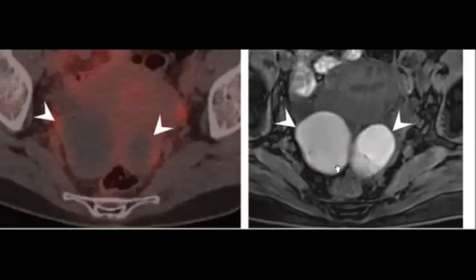And what in the MRI here? I'm checking the answers. What in the MRI? Look at the sequence, try to recognize which sequence. Is the fat here suppressed or not suppressed? It is suppressed, perfect. So when it is suppressed, you imagine that every fat in the image will be suppressed. So why is it high here? That means that there is, yeah, nice.